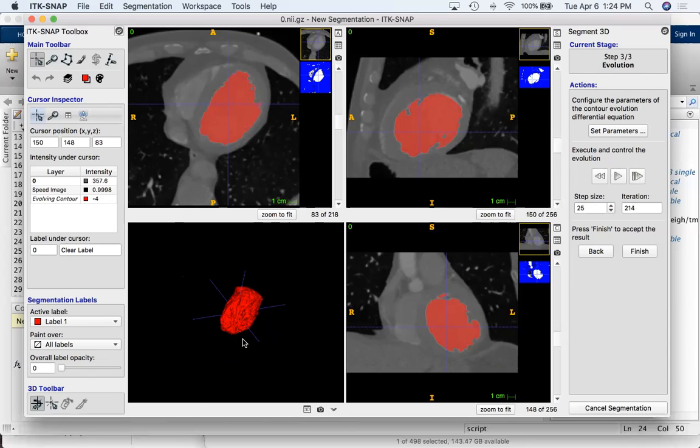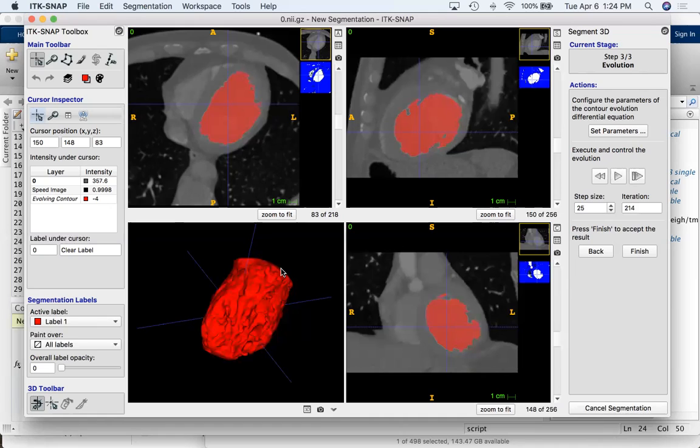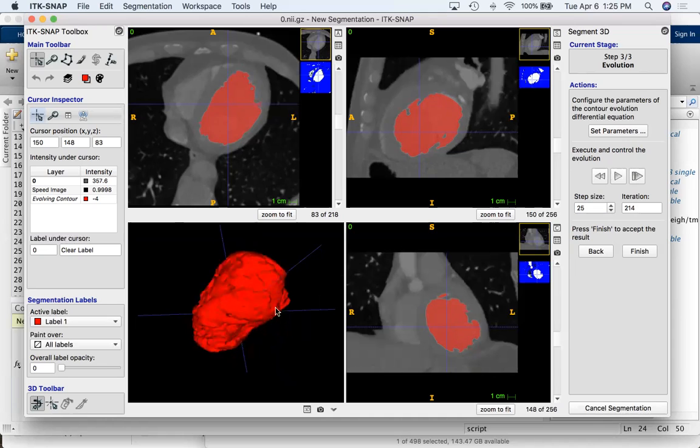And then to zoom in here, I think it's control. Oops. Mouse, and you can zoom in. So you hold the control down and then use the mouse. Maybe if you have a real mouse, it's probably right mouse or something like that. Yeah, right mouse works. Okay. So now we see we're doing pretty well, right?